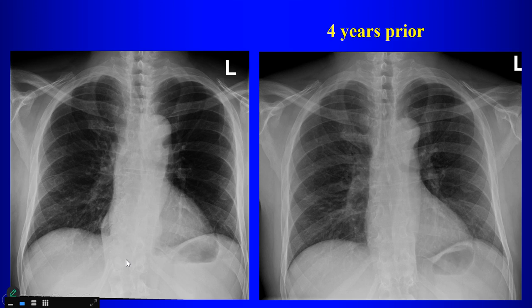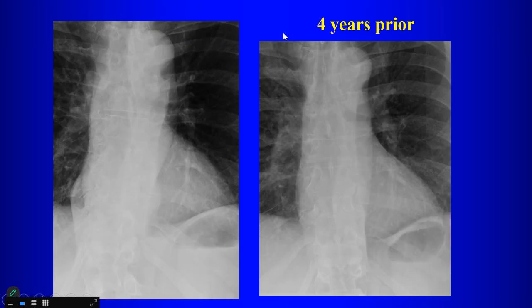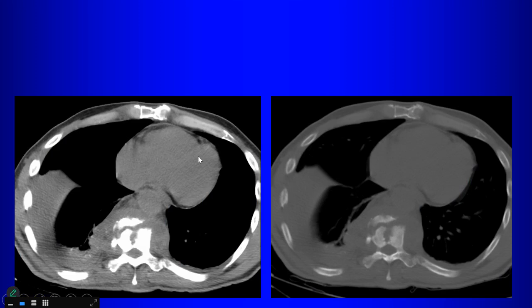that might be associated with back pain, in a lecture on TB, we would consider paraspinal abscess with discitis and osteomyelitis, right? That would cause bulging of the paraspinal lines. And so that's what we have. We have discitis, osteomyelitis, and this is a paraspinal abscess. That's what gives you the posterior mediastinal mass. Okay?